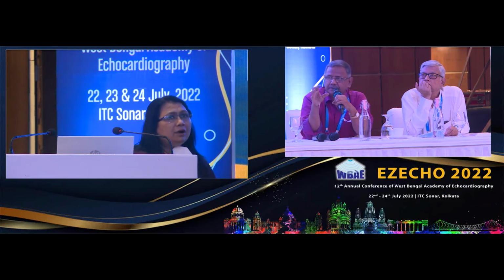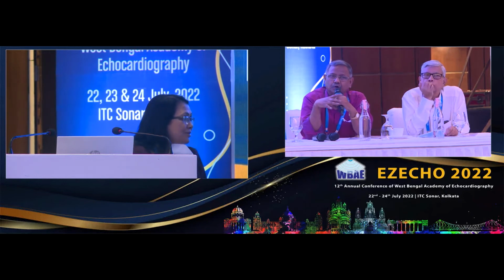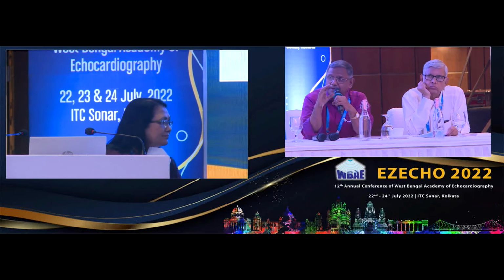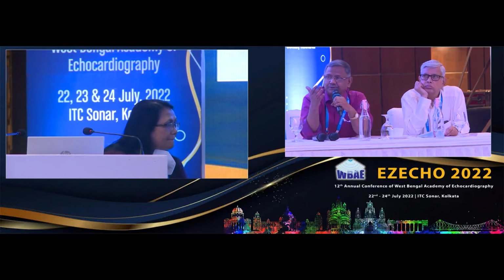No, it's not myocarditis. We are showing the MRI pictures also. That is not fitting with it. We have done MRI. One important thing is whether echocardiography has been done before angiography, what was the diagnosis, and after the angiography, then it is very perplexing.